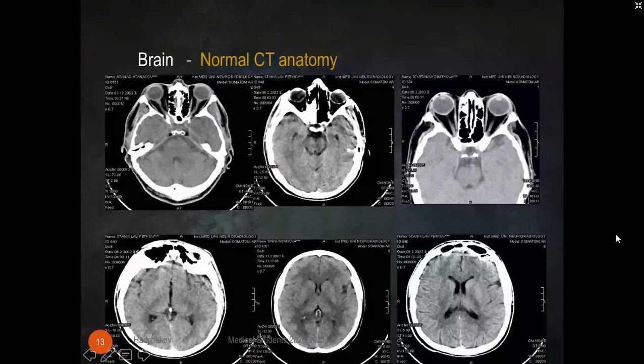On the second row, you have the supratentorial brain, the main cerebral hemispheres. In the middle of the lower row, you can see the basal ganglia running on both sides of the lateral ventricles. Again, a slight calcification. You see it here, and on the previous image.